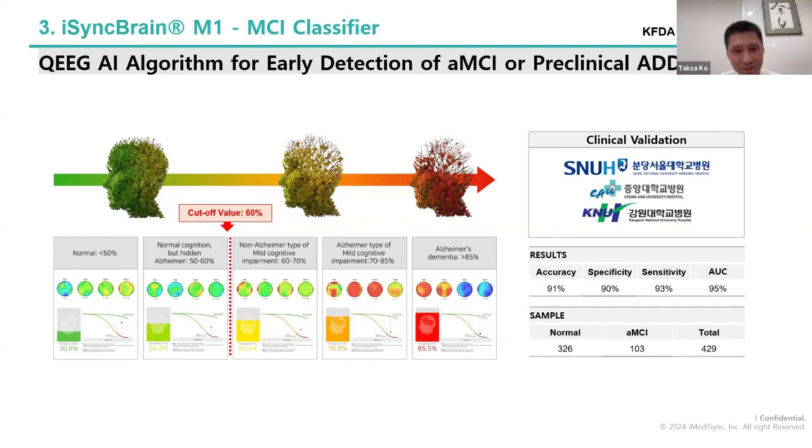That's why we need to review the clean data first, and also sometimes we need to review the iSyncBrain portal. There are a lot of analysis items, so we need to look more closely in those unexplainable cases. So today's lecture focuses on the iSyncBrain analysis, how to understand iSyncBrain analysis in more detail.